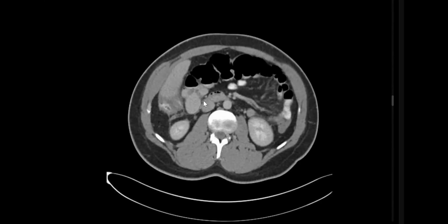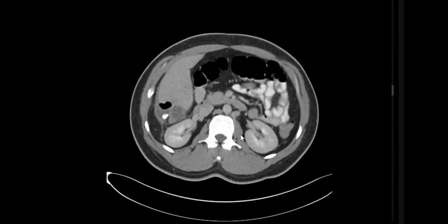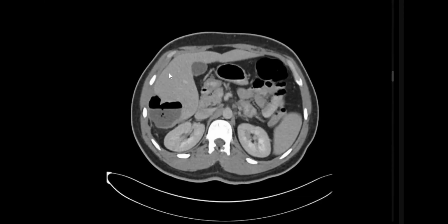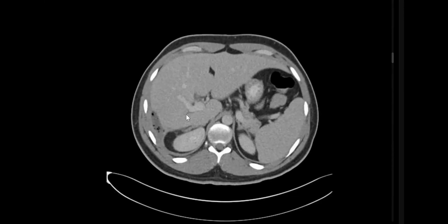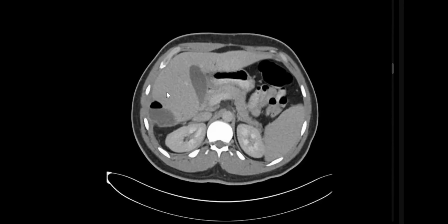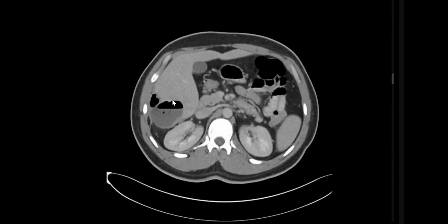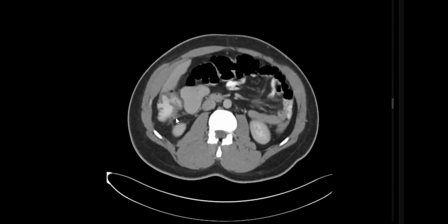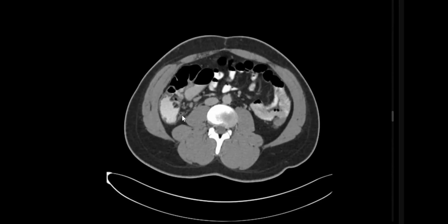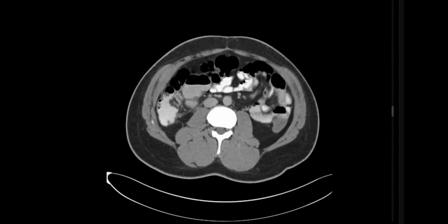Very good, my friend. Again, this is, of course, portovenous phase: no venous thrombosis, no hepatic abscess formation, and no other complications. And also look at the lung window. Very good, my friend. I'll take the mouse now. The next candidate. You see, my friends, here this is the rest again of the appendix. Still here. So it's a case of complicated tip appendicitis.